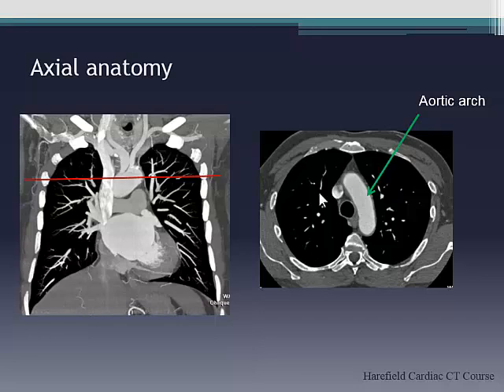So the golden rules that I always teach are to look at the review areas, and I'll show you some of the review areas. The other thing is when you look at the axial image, the most anterior valve should always be which valve? On an axial image, it's always going to be the pulmonary valve, okay? If the pulmonary valve and the aortic valve have an altered relationship, then you start to think about, is this some sort of transposition?